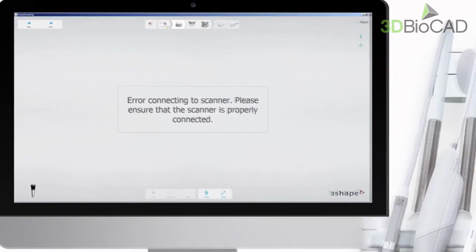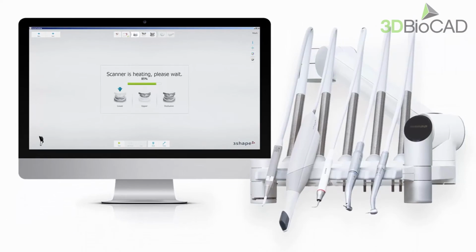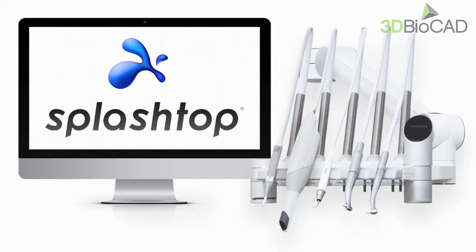Make sure that the TRIOS scanner is properly connected. Now you can start the scanning process. You can mirror the 3Shape software directly on your mobile device. It's recommended to use Splashtop for this feature.